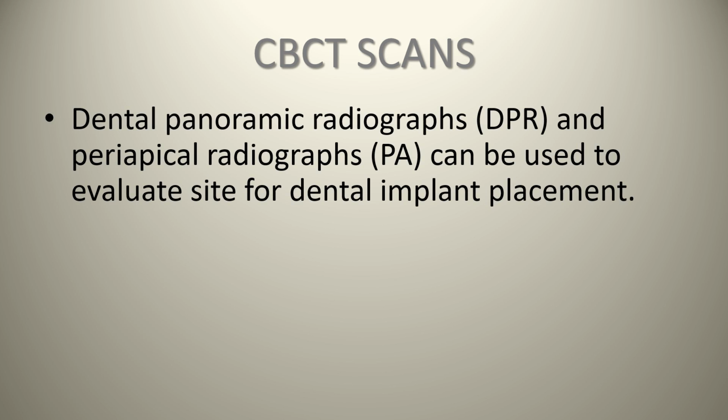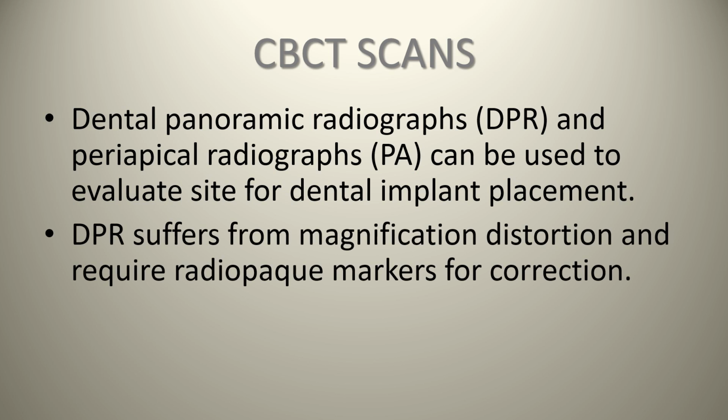So, dental panorexes and periapical radiographs can be used to evaluate the site for a dental implant placement. The problem with the panorexes, as we discussed previously, is that they suffer from magnification distortion and require radio-opaque markers for correction. And I may add one thing: when they say radio-opaque markers for correction, remember, a lot of the times this magnification factor, you will know what it is for your particular machine.